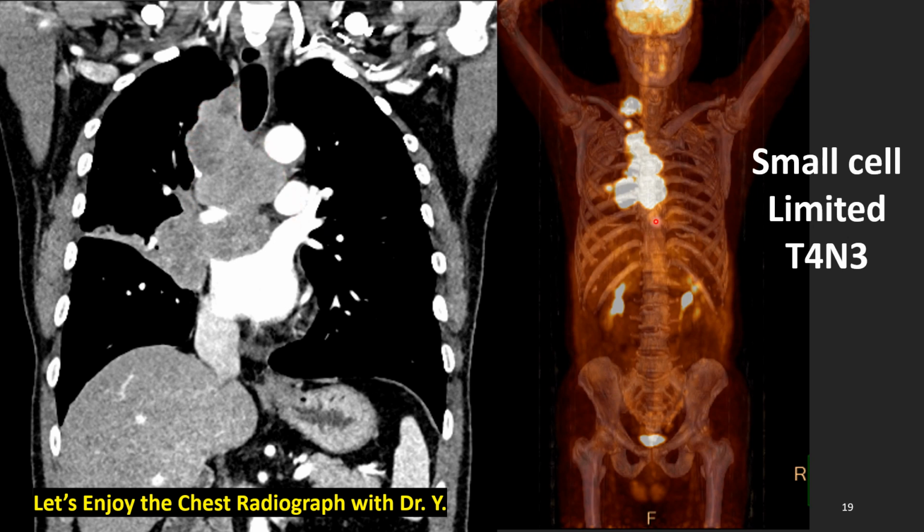Let's look at the PET-CT. More than that, bigger than the CT image, because this is the summation image, not one plain image. Huge conglomerated hot uptake, separated nodule, separated lymph node, large supraclavicular lymph node. Yes. At first glance, this is limited stage. Yes, it's correct. Ipsilateral, unilateral side means limited stage, but T4 and N3 staging, far advanced stage small cell lung cancer. This is the everyday life findings of small cell lung cancer, usual shape.